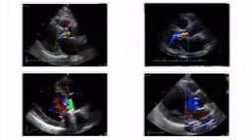And in the next example, we'll show you the same thing, this time in a parasternal long axis view. The question will be, how would you grade these individual severities? And remember, we usually use a scale of mild, moderate, severe, where we also use intermediate stages like mild to moderate or moderate to severe. What do you think is the severity in these 4 cases? Okay, should we give them the answer, Anna? Yeah. Okay. So this is how we would grade the regurgitation.